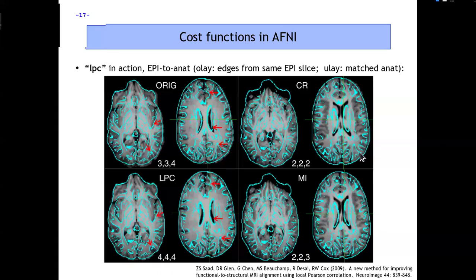Well, but when I really look at the details of the features as the edges show me, it looks a bit messy and things aren't really lining up very well. So this cost function did something about alignment, but it didn't really do the job we wanted. Even here, it looks kind of an odd alignment. If I use mutual information, then similar thing here. It's pretty good and the edges are good, but really the details inside here aren't that great.